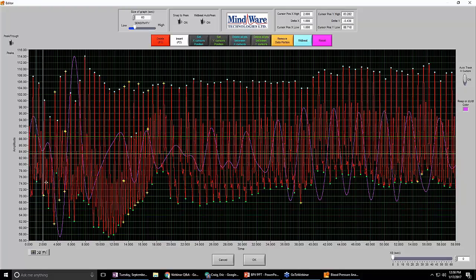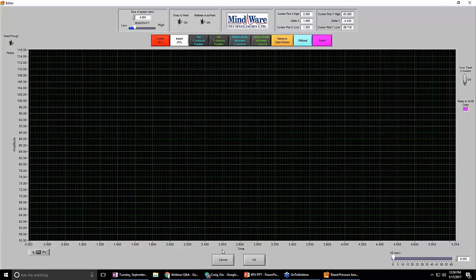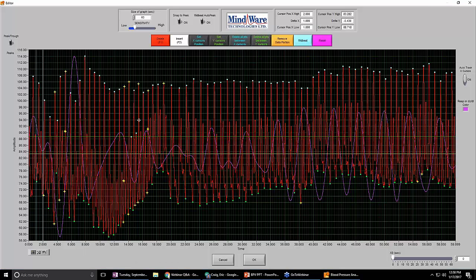To begin with, I'm just going to go from left to right and deal with these series on a case-by-case basis. So we're going to start from the beginning here. I usually like to use these tools. The second one here will give you a good look at the information without jumping into it too much.